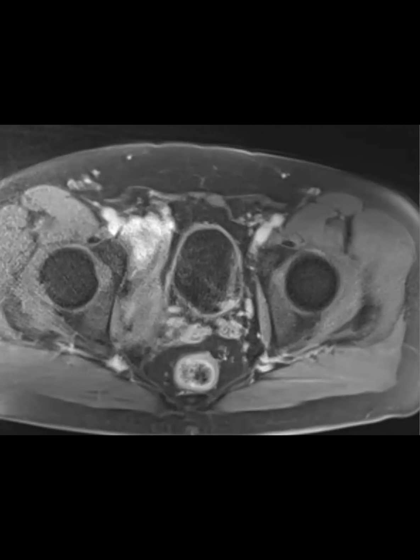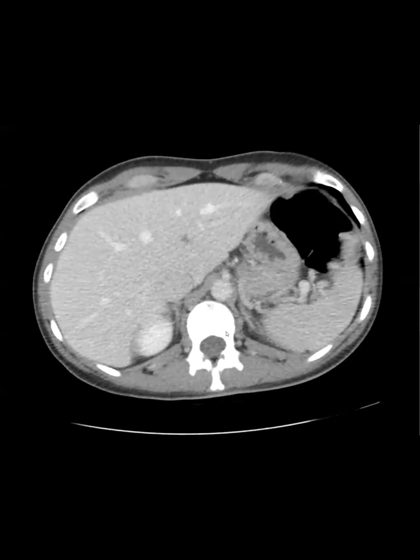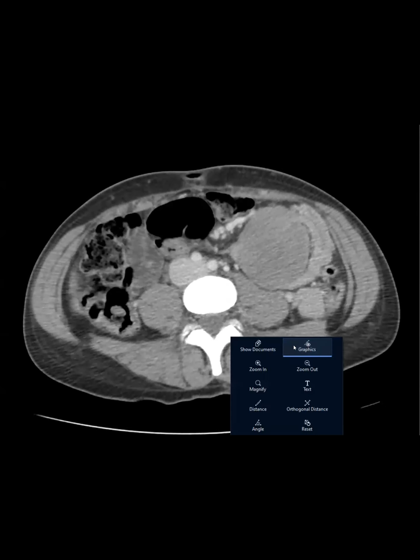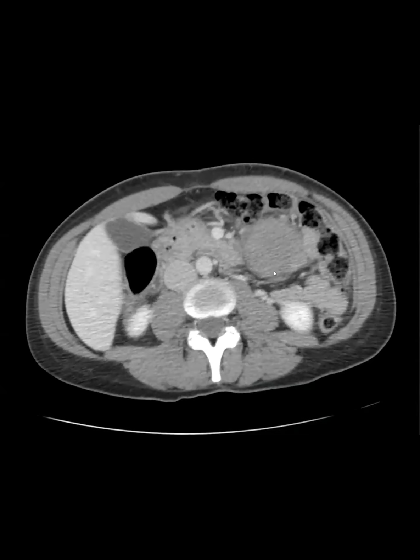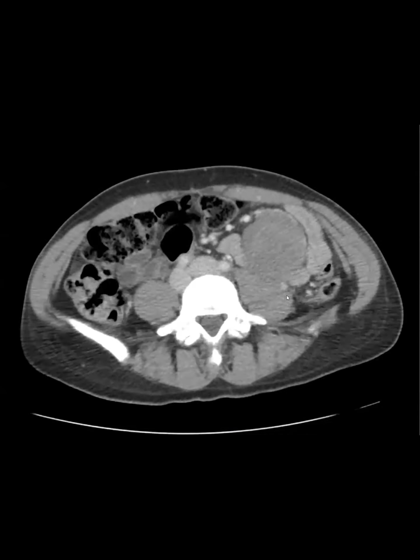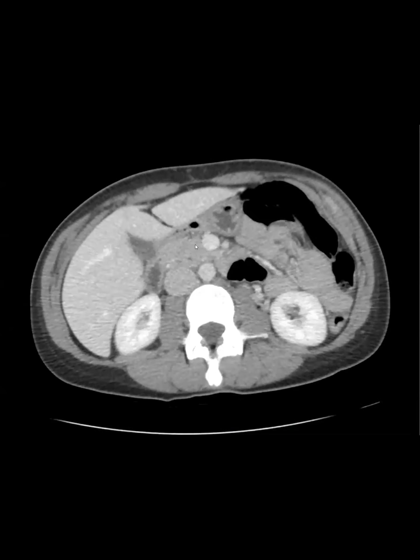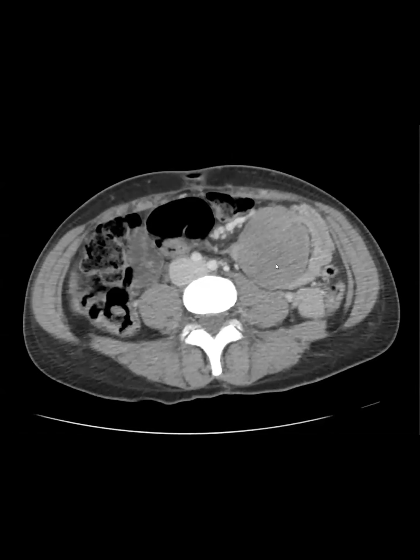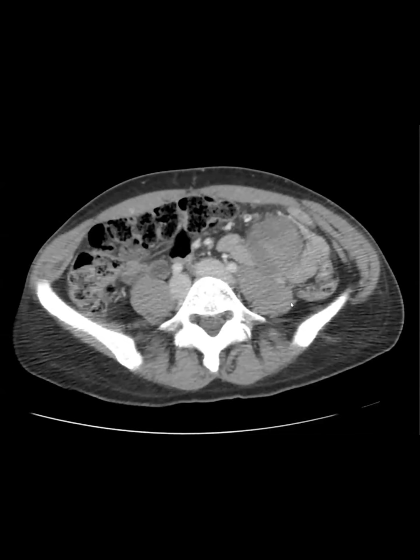So I wanted to just make a couple of points about desmoid fibromatosis, but actually I want to show you a companion case. Let me just pause for a second. Okay, so this was a younger female, and this is a companion case, and we saw this very homogeneous mesenteric mass. Couldn't exactly see where it was arising from. It looked separate from the pancreas, but because it was very homogeneous, we also brought up a desmoid, and we brought up a GIST tumor.